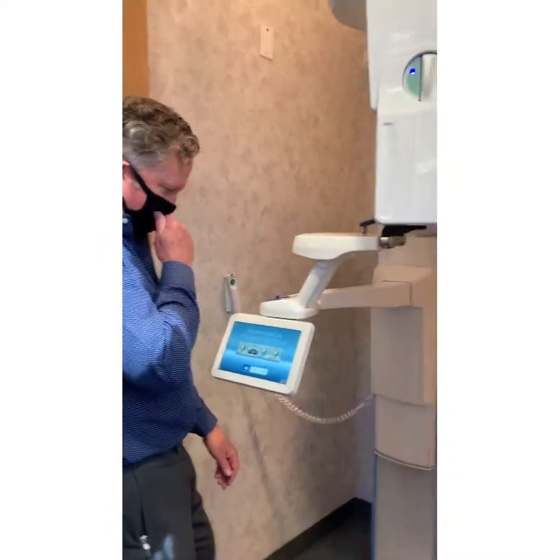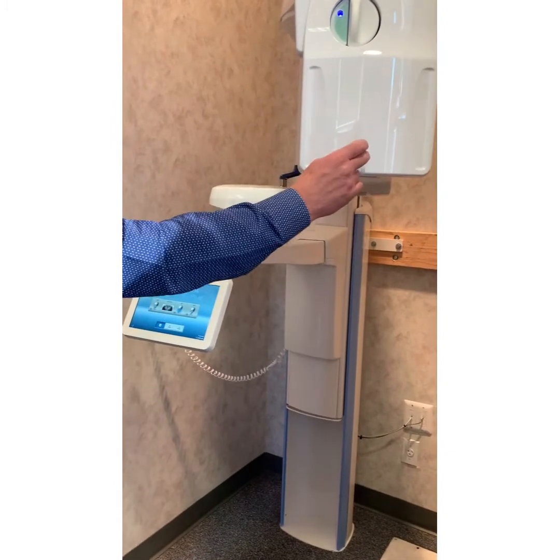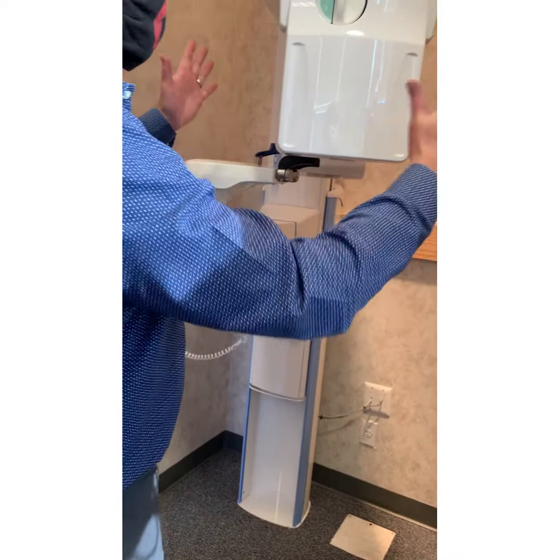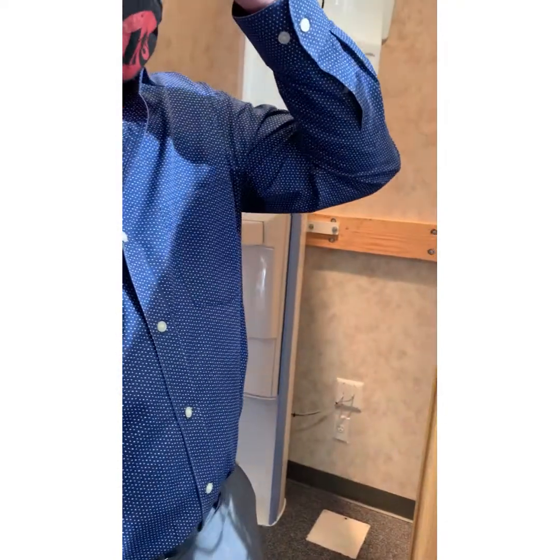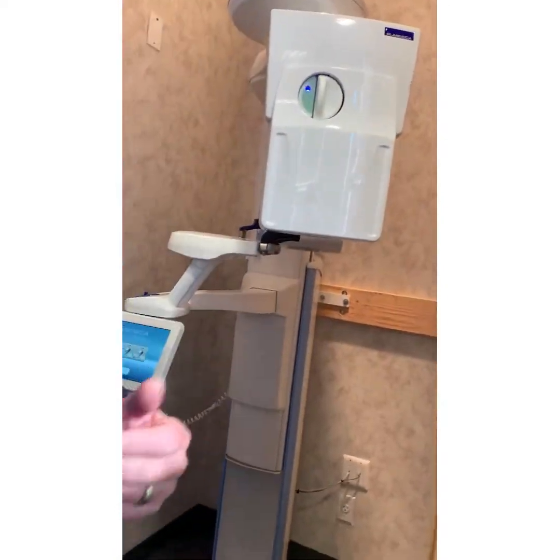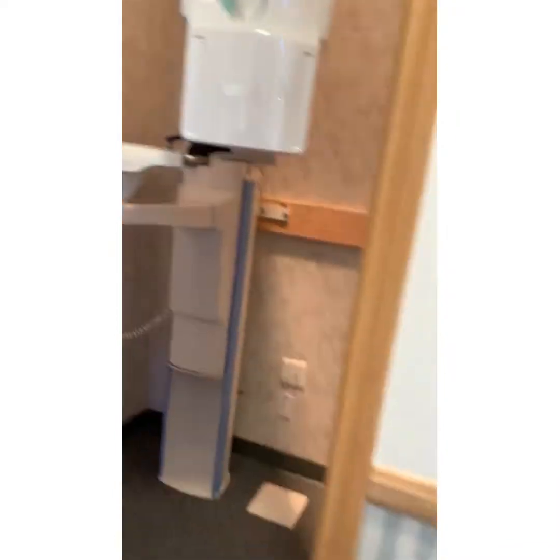Now, is that going to change the calibration in the software? Does he have to unload or reload or do anything? No, I'm concerned because the last part of calibration requires this to be expanded. And because this was brushing the wall, it obviously didn't affect what you're getting. The volume is as it should be. I don't see any weirdness in that, but these things concern me over time. Plus, that's tight for somebody trying to get in there. Well, yeah, and that's a small woman.